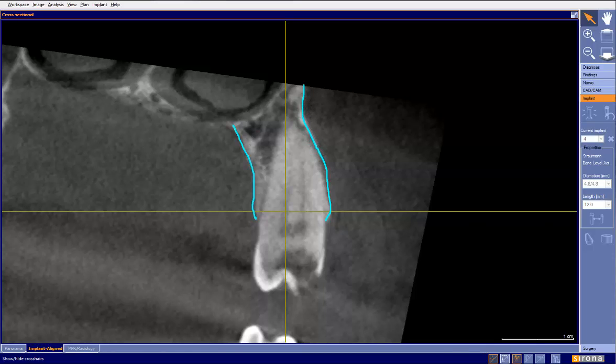just like so. And then I like to go ahead and outline our tooth, which is just like so. So based on this information, the first thing I notice is that the only area, and I'm going to put this in green so we can signify it as what I call the go zone, is right here. So this is the area that we can gain stability from our implant.